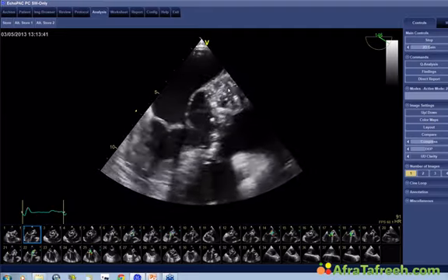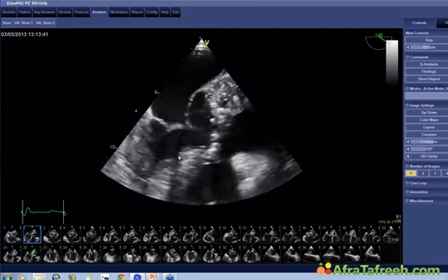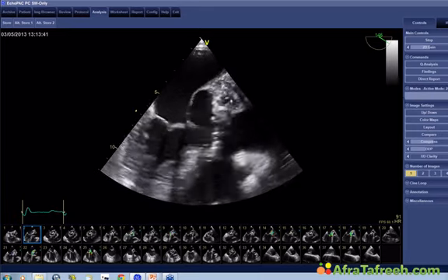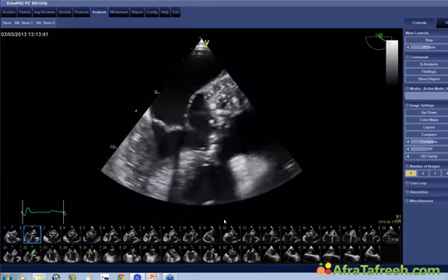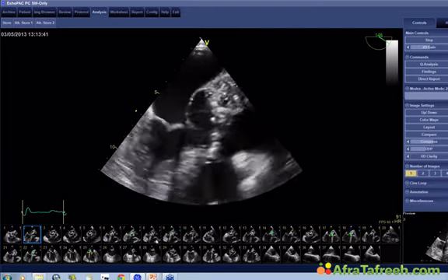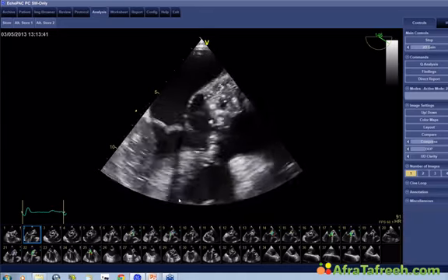What usually happens is that we have an abscess formation around the aortic valve, and then this abscess breaks through, drains, and then we have a cavity here, which in this case is septated and looks like a honeycomb. Yes, Mayada is completely correct.